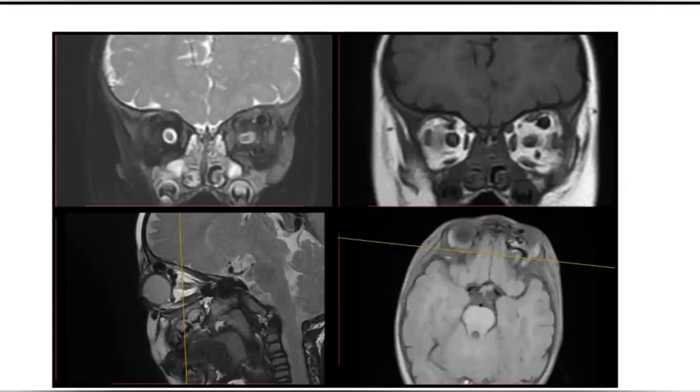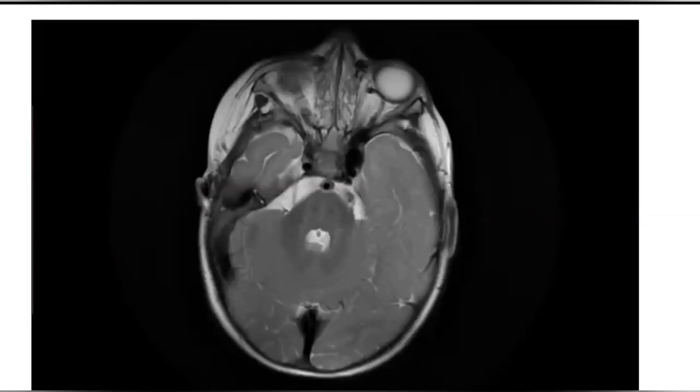So wonderful. Now we'll go back to the previous film. Now can you appreciate something there? Yes, there is a hypointense lesion at the expected location of the cavernous sinus. All right. That is the same lesion as the hypointense lesion.